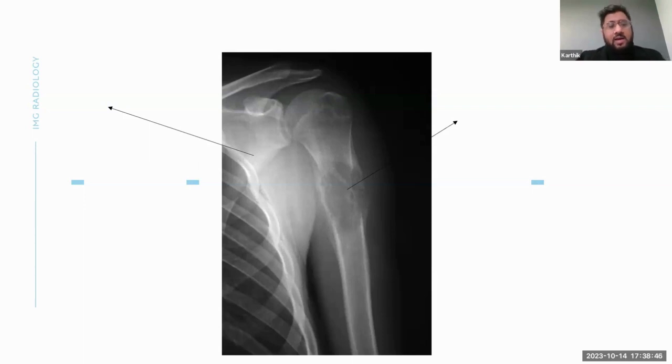Okay, so first, if you can point to that, you have some opaque bone there. And then you have an area of lucency. So this is essentially a lytic lesion, commonly seen in patients with multiple myeloma. Normally you get this in the vertebra and you get what's called compression fractures, but here you can also see it where there's sort of a hole almost created. And sometimes they could actually support this with surgery.